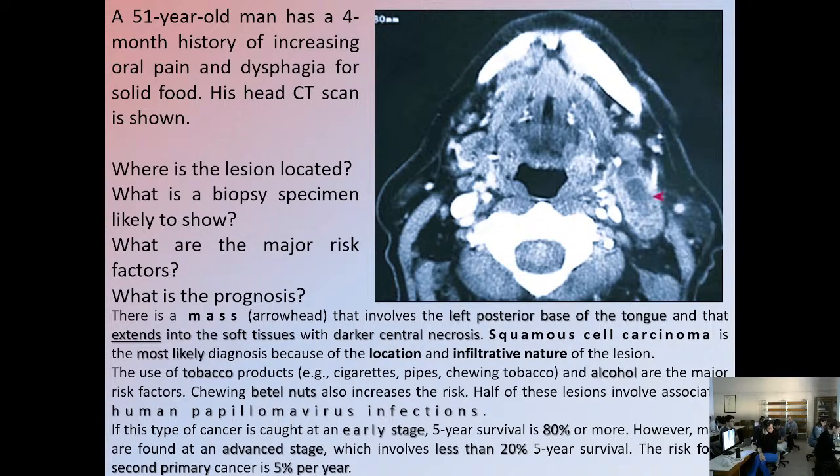So in some cases, it's clinically important to give this information to the clinician if it is an HPV-related squamous cell carcinoma. And there is a common immunohistochemical marker which is overexpressed in HPV-related cancers. This is P16.